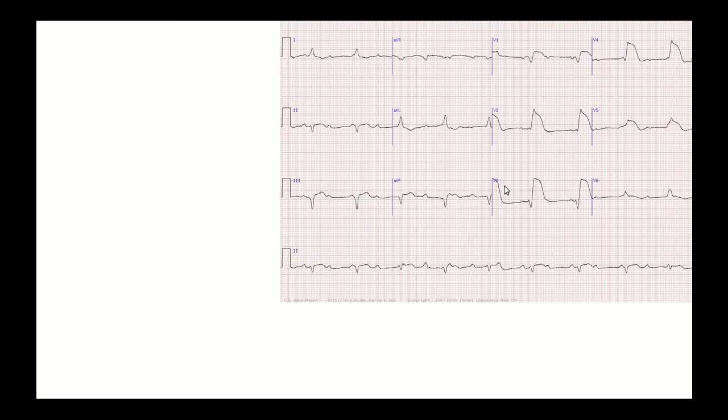The important thing to note is that this patient, while having PCI, while having a stent put into their LAD or their left system, wherever it needs to be put in, probably warrants having a temporary pacemaker put in, even if they're not using it now. This ventricular escape rate might not work in the long term, and you would hate for them to lose their escape rhythm in the middle of the night and have to put in an emergency temporary pacemaker. So putting a temporary pacemaker in for a couple of days wouldn't be a big deal.